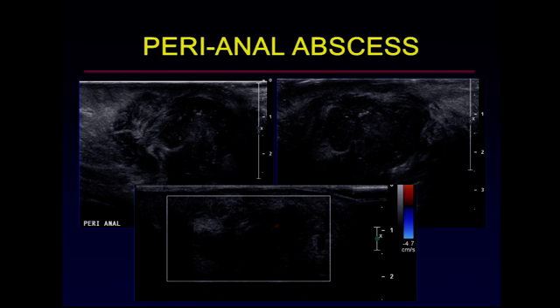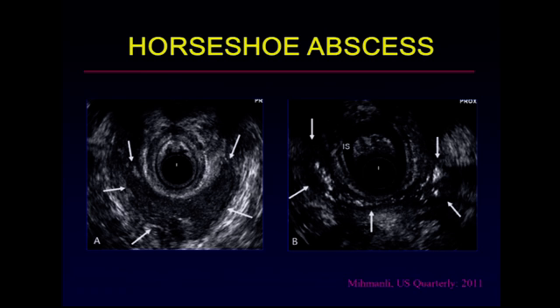If you did, you'd be concerned more that you had a phlegmon or an underlying mass rather than a straightforward abscess. These are some examples from the literature demonstrating in both cases very large horseshoe or U-shaped abscess posterior to the anus and posterior to the sphincteric complex, which, although immediately juxtaposed to the abscess, is not affected by it. The patient on the left has a relatively homogeneous fluid collection of intermediate echogenicity.